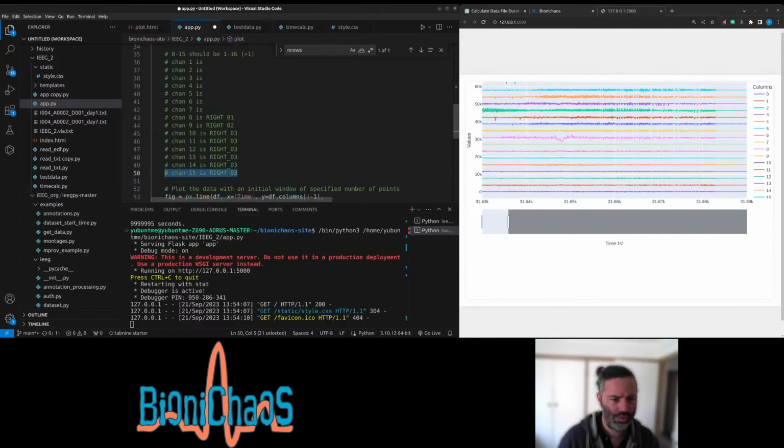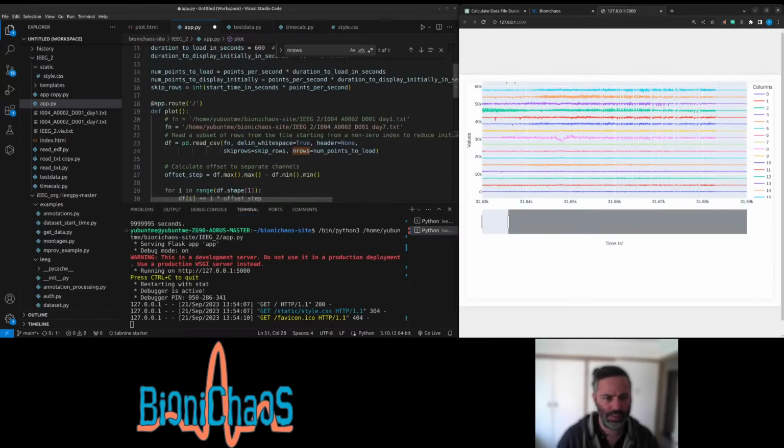15, 16 to get the names correctly. There's not too many of them, so we might as well do it manually. So in theory, right now this doesn't make sense. 3, 4, 5, 6, 7, 8. So what would this one be? It's 16 something. Something isn't right.